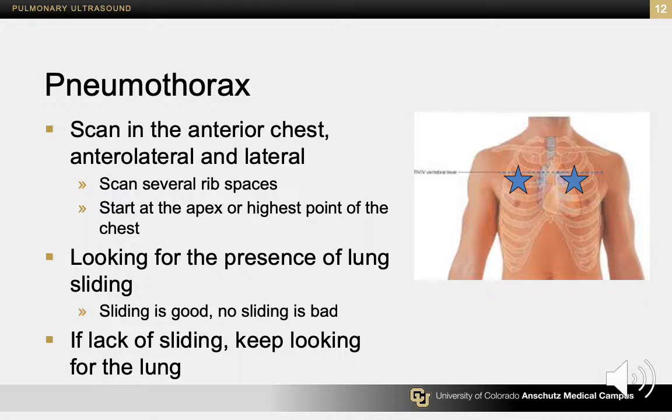It's indicative of pneumothorax, but there's a number of other conditions, including COPD, asthma, pleural effusions, apnea, main-stem endotracheal tube, patients that have had a pneumonectomy or lung transplant, and then blebs, which is basically a subpleural air collection that typically occurs in smokers. Those can all also have an absence of lung sliding. So just a caveat there, I guess.